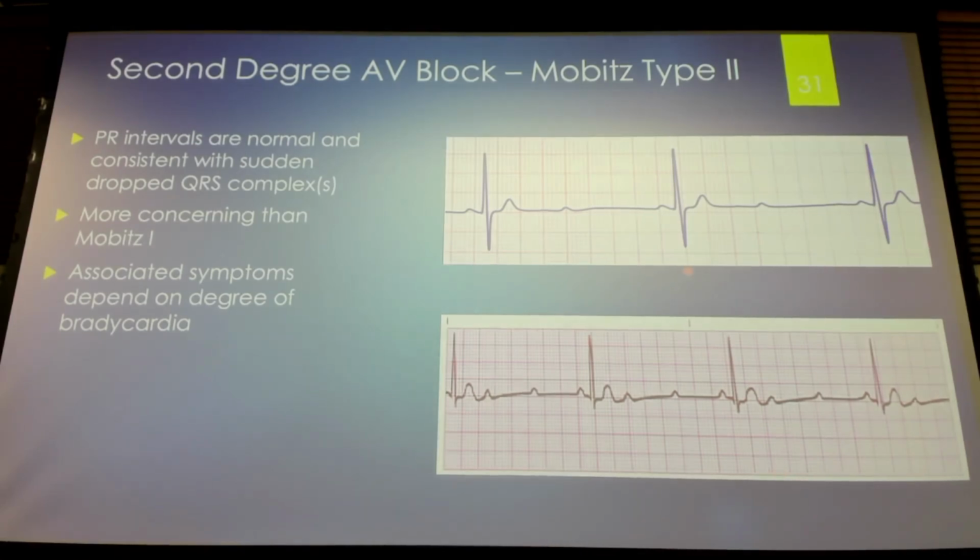Okay, so here we have a PQRST, we have a P without a QRS. But here we have a P wave, here's a P wave, so now we're missing 2 cycles. We have only atrial depolarization with no ventricular depolarization. Imagine if you had a PQRST with a P wave with a QRS drop, QRS drop, QRS drop, QRS drop, and then finally you get a QRS. We have really minimal circulation going out to the body, right? So PR intervals are normal, but you have spontaneously dropped QRS complexes. You have P's without QRS complexes.